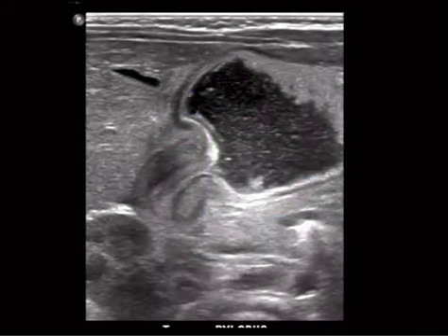All right, next case is an actual GI case, an ultrasound case. There's only a few things with regard to GI that you can show on ultrasound. I'm going to try to show them all. This is the first one. So you probably immediately recognize this as a pyloric channel that is thickened.